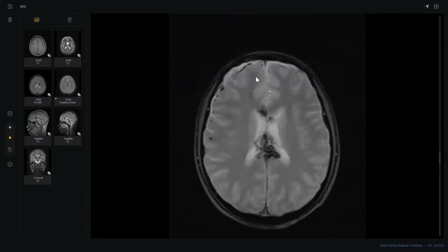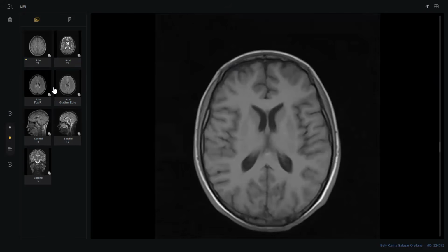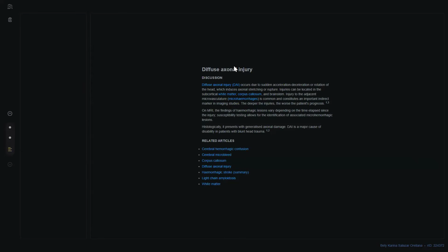What does it mean for you? These collections could be related to fracture with subdural hematomas. Yes. So the final diagnosis here, grade 3 diffuse axonal injury. The differential diagnosis in trauma case, we must rule out fat embolism.